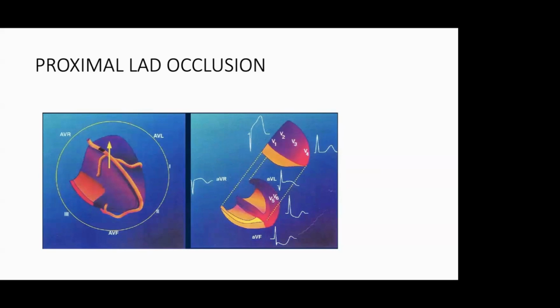How do the ECG changes come in that area? This all depends on the injury vector, because the myocardium which is injured will drive the ST elevation. So the ST elevation is in the leads which are looking directly into that area. So when the proximal LAD occludes, then the septal as well as the diagonal as well as the mid distal entire LAD territory is occluded.